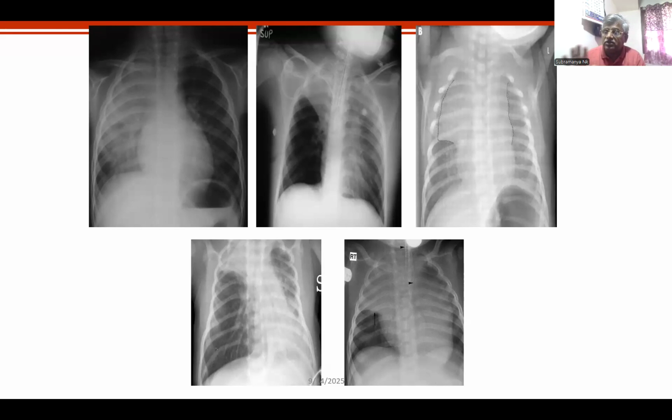Now I finished all the lobes for you. The only problem was the right upper lobe because there is thymus. And how would I explain mass? Mass in the right upper lobe has the same findings as a mass in the left lower lobe. Also apply the same rules there. It applies there. Next, I'll go further.